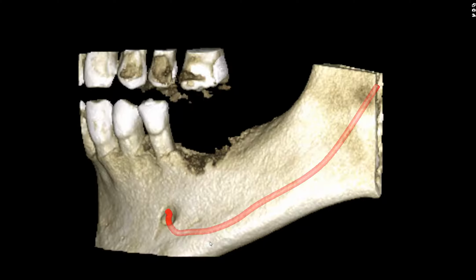Today I want to take a moment to show you what a grafted site looks like under cone beam CT scan. So here's a 3D rendering of site number 19. This tooth 19 has been extracted. At the same time of the extraction, the graft material was placed in, and several months later, a cone beam CT was taken at this site in order to evaluate the shape and size of the ridge as well as the status of the graft material.